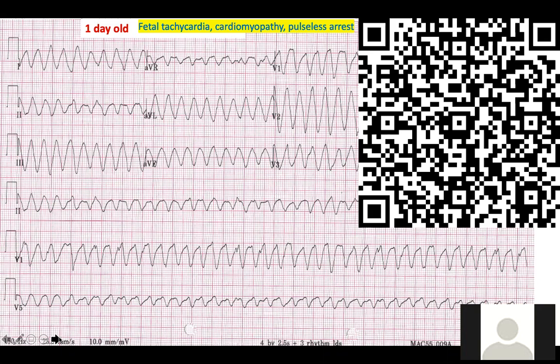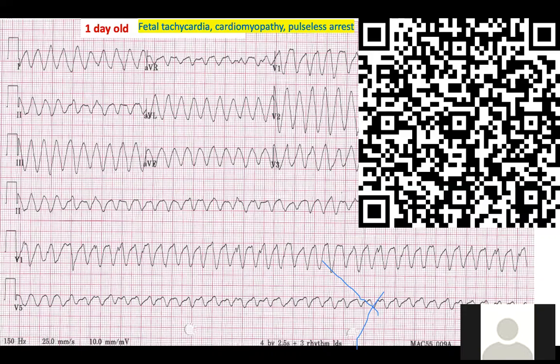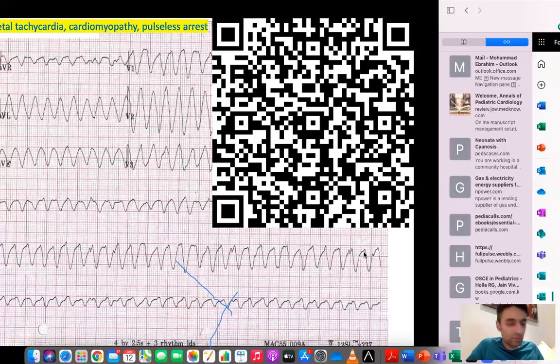Rate how much, Dr. Mohamed? Well, you tell me. I'm sitting in 10 big squares. Something fast. Okay, someone is sharing my screen. Okay, done. Something fast, roughly 250. Okay, let's see whether there is enough time. I'll just see whether this is working.